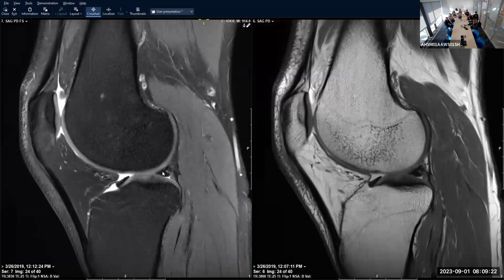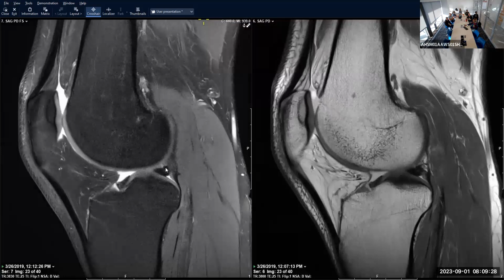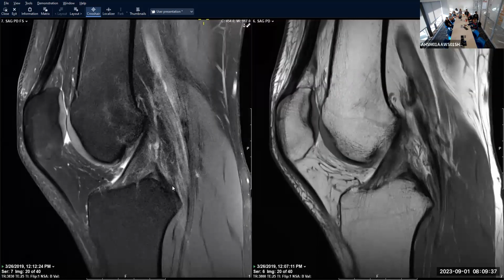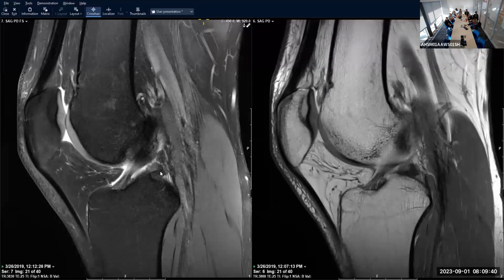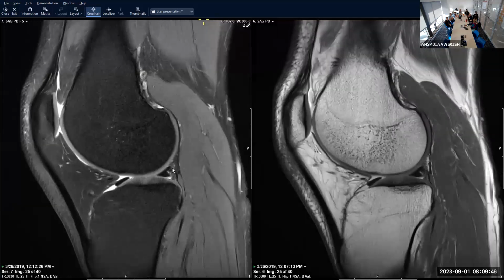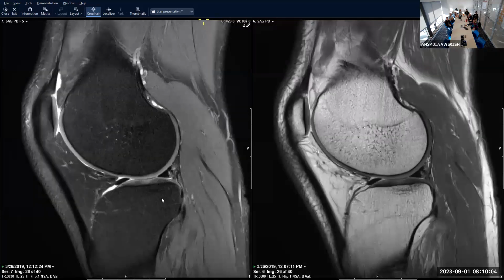You're not allowed to have signal in your lateral meniscus posterior horns. There's going to be some signal where this Wrisberg is attaching, right? That's normal. But it's not supposed to extend more lateral than about 14 millimeters from the PCL's tibial attachment. So if this is our PCL tibial attachment, I'd say one slice here, maybe 2 slices, 3 slices, 4 slices, I'm still seeing some signal, 5 slices, 6 slices, still seeing signal, 7, 8. So this is too much signal. In any other case where there's an ACL tear, I'm probably calling a Wrisberg rip. You should know that our slice thickness is 3 millimeters here, and that's why I'm counting the slices. I just take how many slices, multiply by 3 millimeters, and that tells me how far I've come.